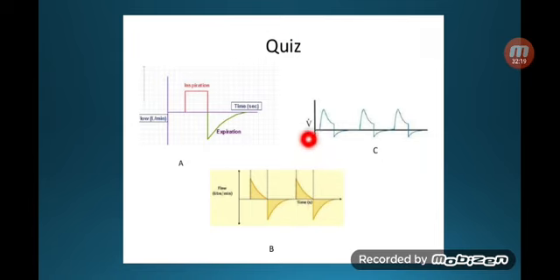What is the problem with this one? Correct, we need more I time for this patient because apparently the curve is not going back to the baseline from the inspiratory point of view.